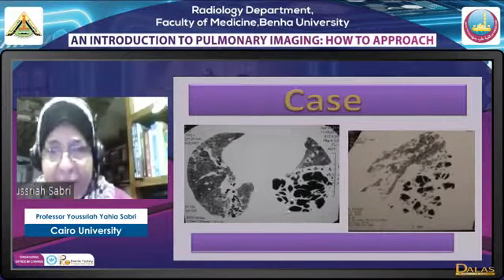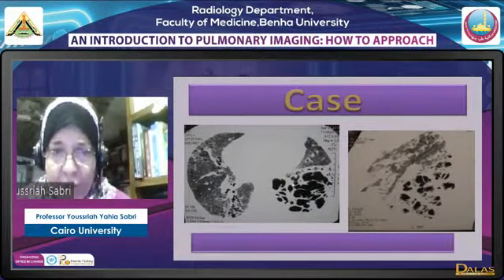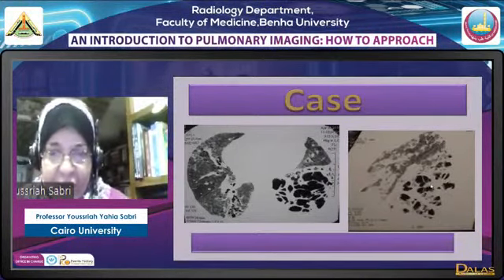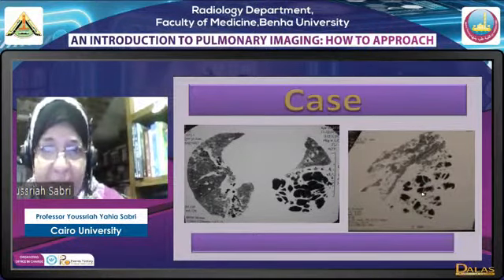Now we have a similar appearance here, multiple what look like cystic, bizarre-shaped cystic lesions together with opacities in between. But here we have shift of the mediastinum, of the fissure. There is mass effect here. The fissure is displaced by the lesion. This lesion actually could be lobar, and in this case, it could be segmental, it could be subsegmental, it could affect the whole lung.